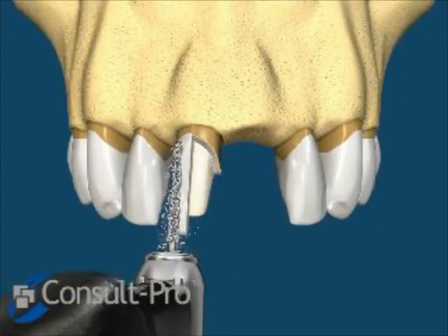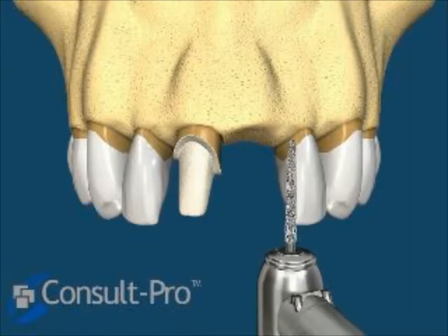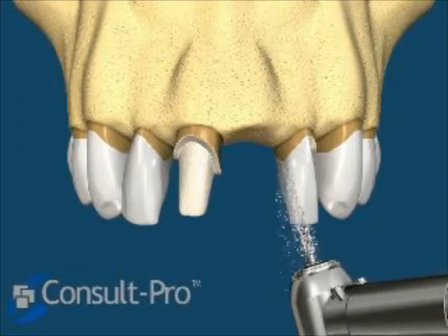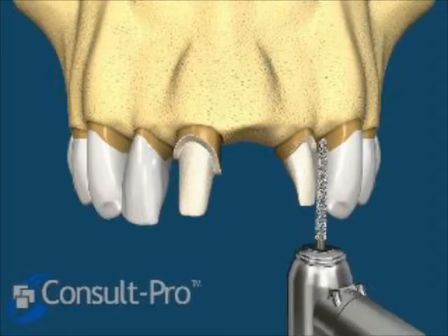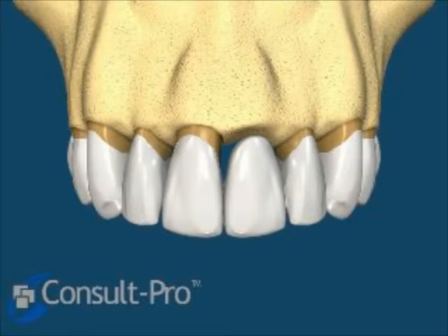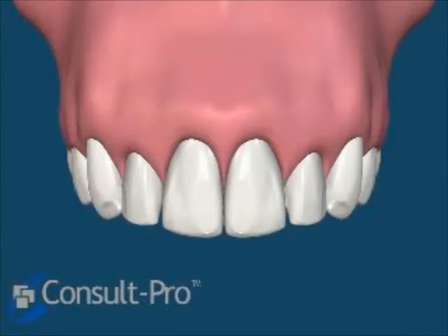Many people in the past have decided to go ahead and prep the adjacent natural teeth, destroying the natural tooth structure in order to facilitate a very quick and efficient 3-unit bridge. You'll notice that there are some risks with doing something like this. It's clearly shown on this animation.